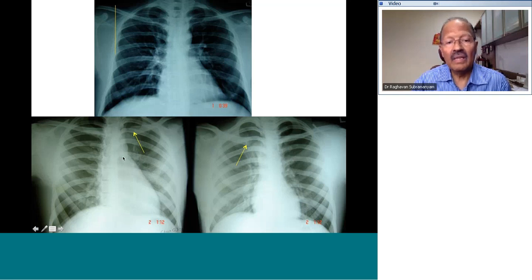For example, in this X-ray, the patient is turned more towards the right, and therefore you see a bigger gap between the left clavicle and the manubrium and less here. You see that the heart shadow tends to give you an impression as if the RV outflow tract, the pulmonary artery and the aortic knuckle are more prominent than usual.